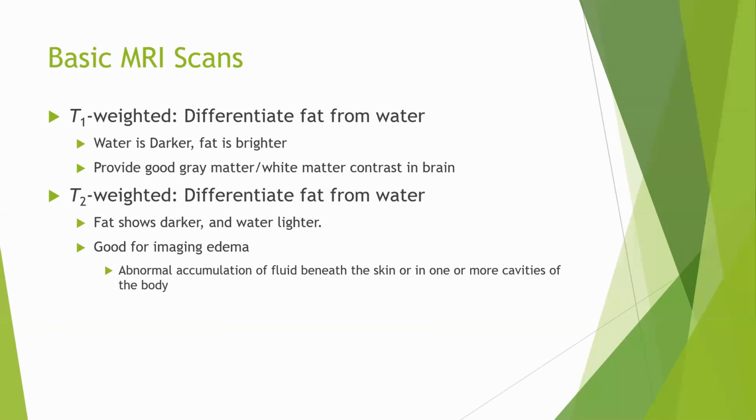So why do I want to see T2 weighted images in orthopedic conditions or musculoskeletal practice? Nothing but soft tissue differentiation. And if there is any trauma, there will be inflammation, inflammatory response, and you will have fluid, and fluid will be white in color. So it doesn't matter if it's a contractile unit or non-contractile unit, there will be some amount of inflammatory response in that local area, and you will be able to visualize that as a very bright white colored area in a T2 weighted image with soft tissue injury.